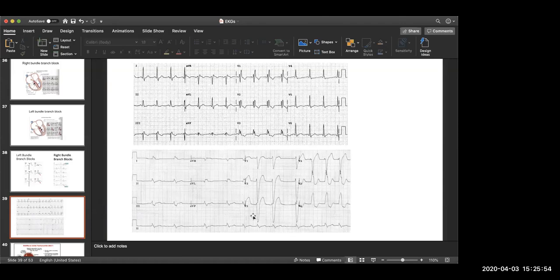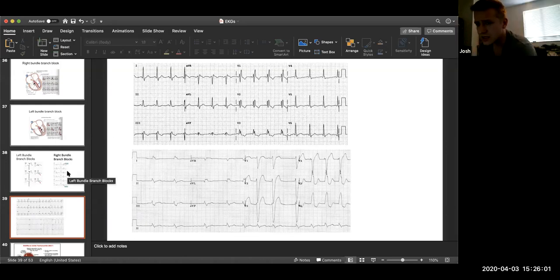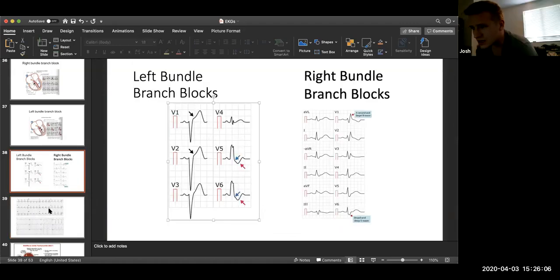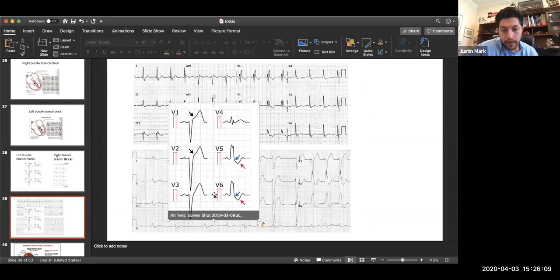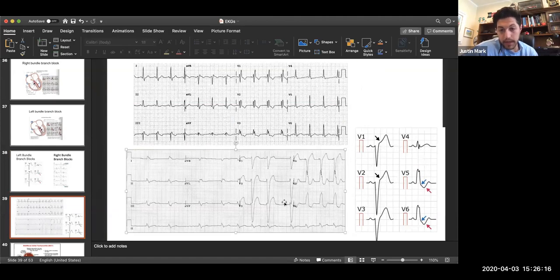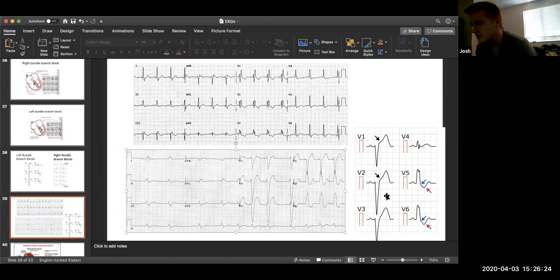The left bundle branch. One thing I did want to mention. What are the defining characteristics of that bottom one? For the bottom one? Yeah, like left bundle branch block. Sure. So at this point, it's basically pattern recognition. When you start to do a lot of these, you'll start to recognize. But to me, this looks nearly identical for the most part. What about V1, V2, and V3? Well, I guess V1 through V6. What about it is different than normal?